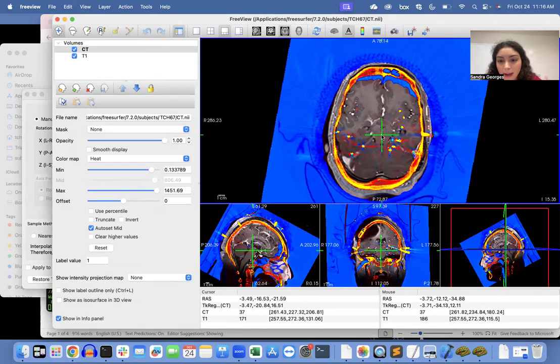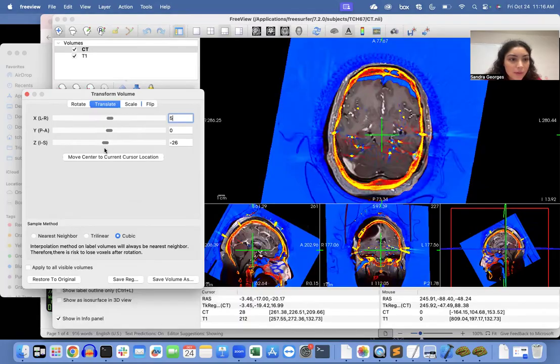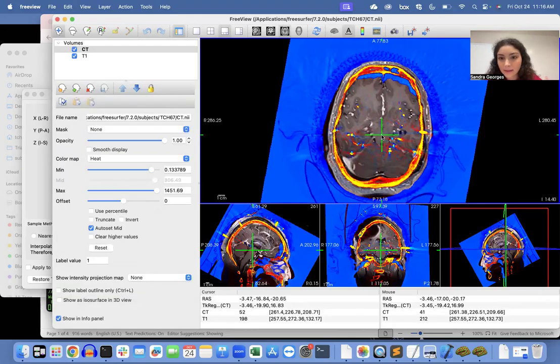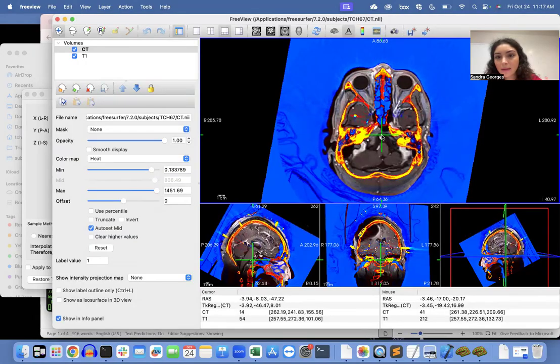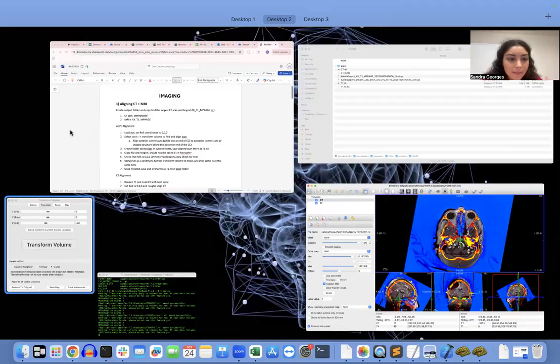Okay, perhaps moving this up a little bit would be useful. So let me translate this, or maybe this way. Let's see. I think when you center the eyes, the rest are a little easier to fall into place, but it's still not perfect, and that's okay. We'll keep working. Another thing is here, these are off.